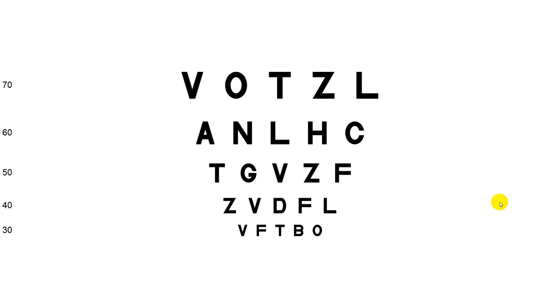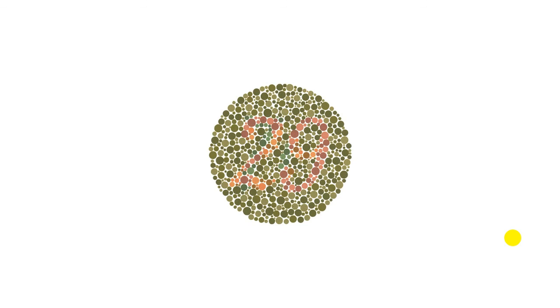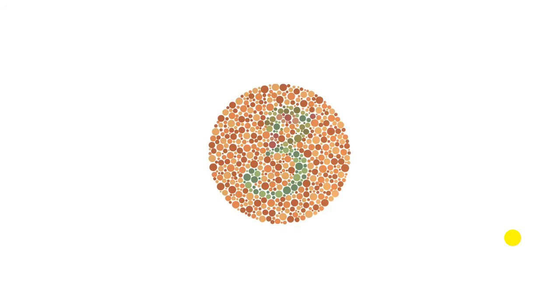So that's basically it for the tutorial. A little bit of tutorial. There's that Worth 4 Dot which we're talking about right there. So this is an astigmatic dial. The dots. This was the disparity chart test. Can't remember what it's called right now. Amsler chart. Yeah, Amsler chart. This is the color test. You can bring that up in size. You can cycle through those by hitting the left and right arrows. So you get that.